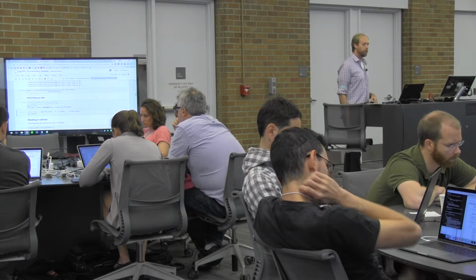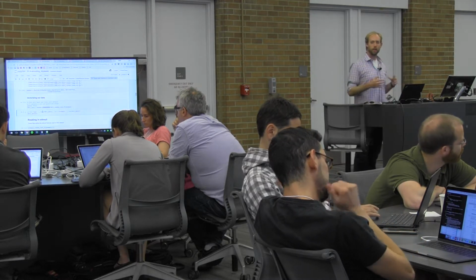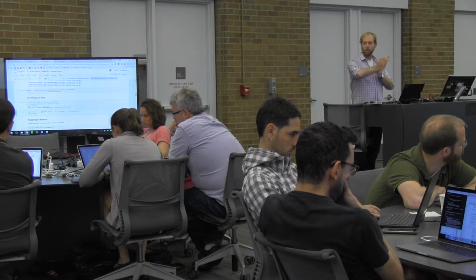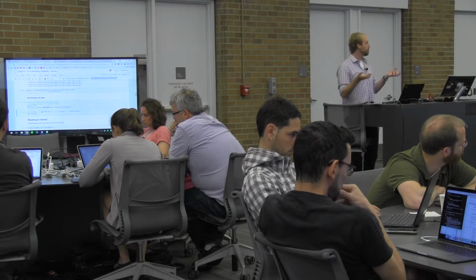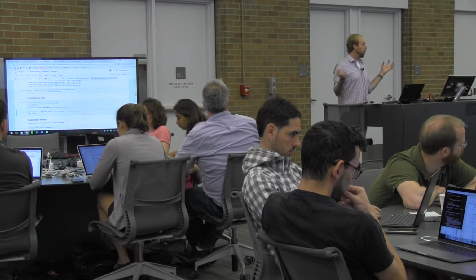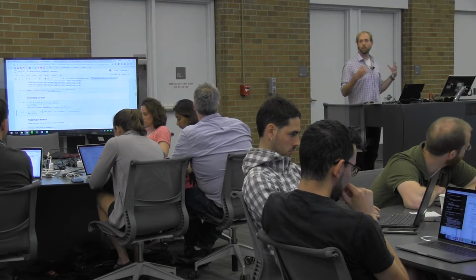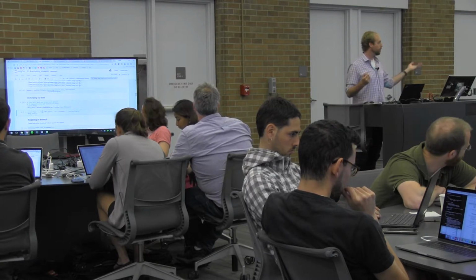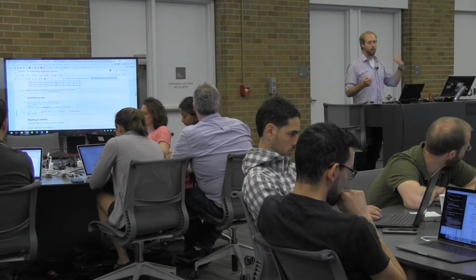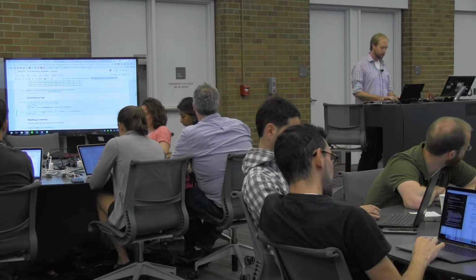This is really useful because a lot of times you have voxel data that are in different kinds of files, but ultimately you want to concatenate them. But you only want to do that in memory, for the purposes of actually fitting the model that you want. Usually you want to do this because combining all of the 3D data into one file would be extremely large. So you want to apply that mask first. Extract a subset of voxels you care about so that it will fit into memory and you can concatenate it all as a scikit-learn object.